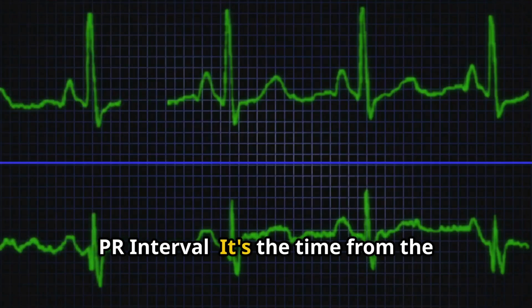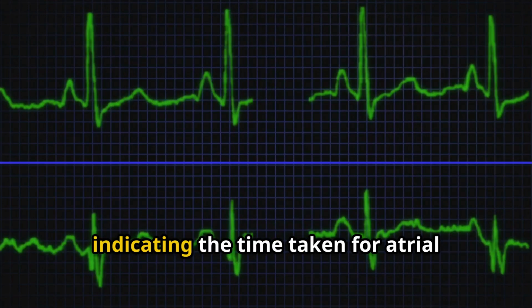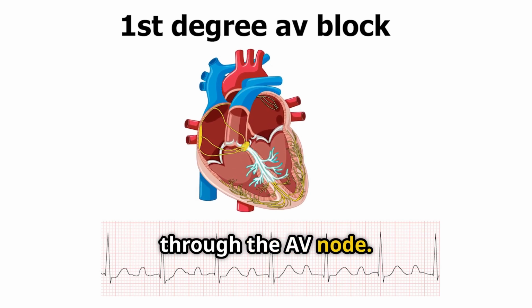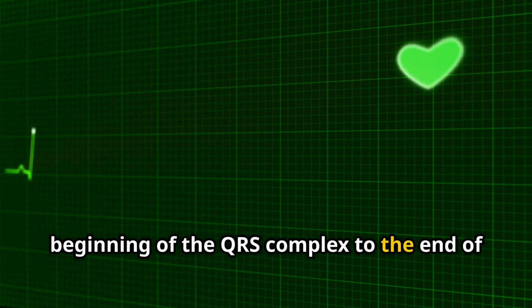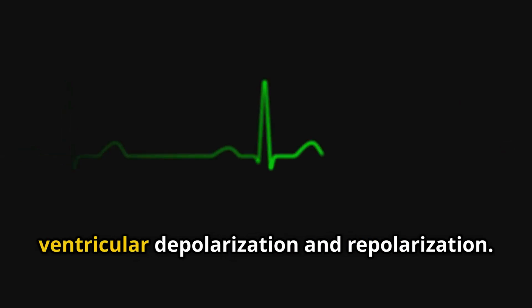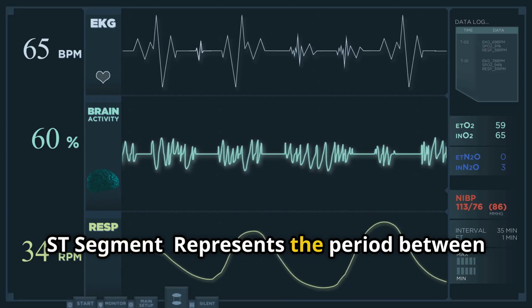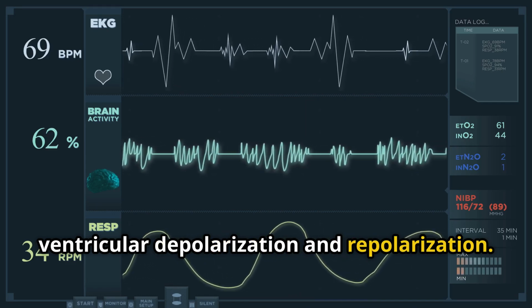PR interval is the time from the beginning of the P wave to the beginning of the QRS complex, indicating the time taken for atrial depolarization and impulse conduction through the AV node. QT interval is the time from the beginning of the QRS complex to the end of the T wave, representing the total time for ventricular depolarization and repolarization. ST segment represents the period between ventricular depolarization and repolarization.